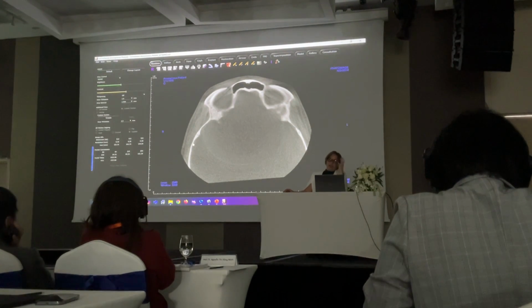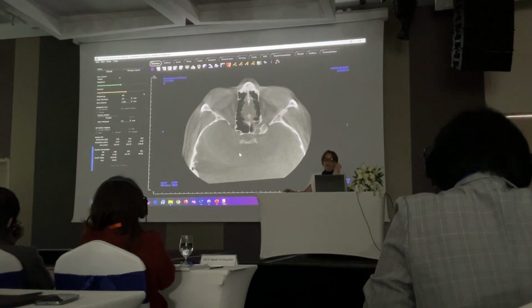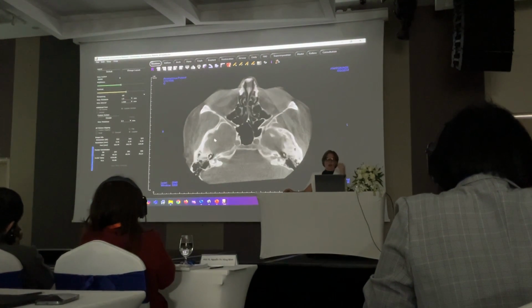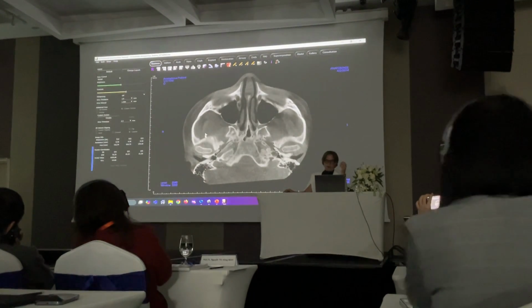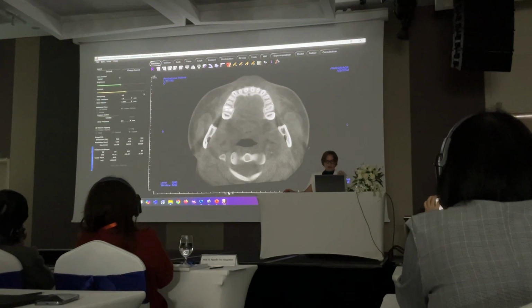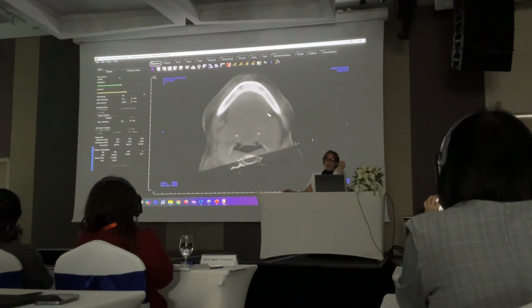If you see a destruction of bone adjacent to a soft tissue tumor, or a soft tissue going into an air-filled space, you'll be able to see that. But that's the extent of it. So you're looking for calcifications, and you're looking for destruction of bones and changes in the air-filled spaces. So taking it all the way down into the neck to make sure that there are no calcifications anywhere in the soft tissue. Okay? Okay, great.